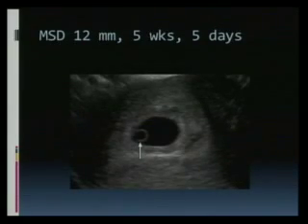All right. So here the mean sac diameter is 12 millimeters. Can anybody tell me how to measure the mean sac diameter? Tom? Good. You measure 3 dimensions. So you do a split screen measurement. On the same screen, 2 ultrasound images can be acquired. And on the transverse image, you're taking 2 measurements. On the sagittal, 1 image. And then the computer calculates the mean sac diameter, and based on 2 or 3 algorithms that are already fed into the computer, it will give you an estimated gestational age.